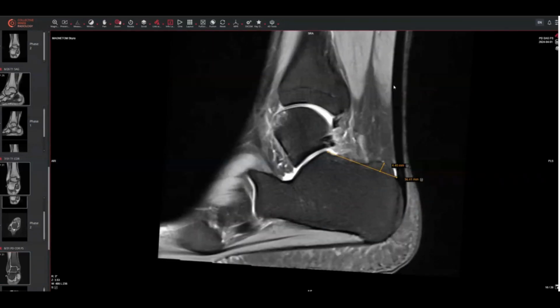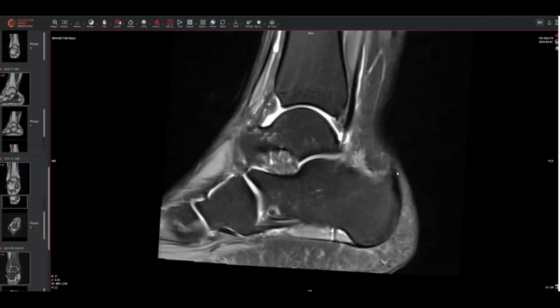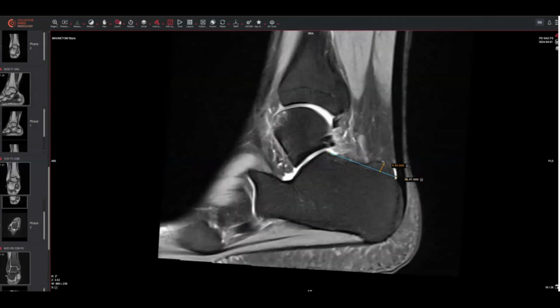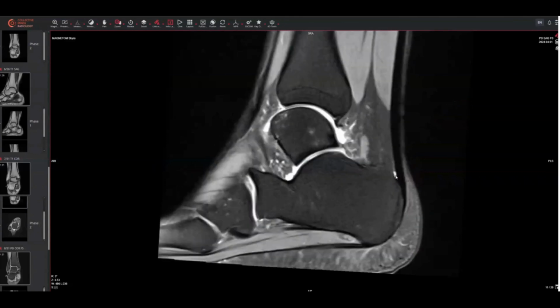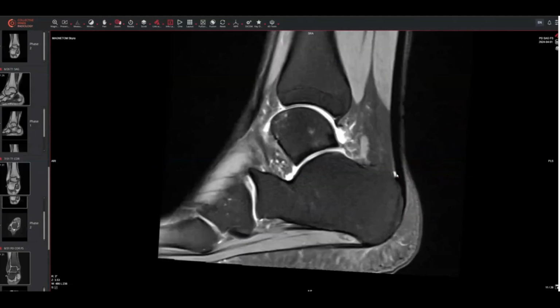The Achilles, appreciating that the soleus is inserting in the myotendinous junction above the level of the tibiotalar articulation, otherwise it would be low-lying and may predispose to claudication. The insertion is intact. Notice that we have some trace retrocalcaneal bursitis, and I've drawn a line here just showing us the Haglund bump in this patient who does not have the full syndrome that I can see of Haglund syndrome, but I can imagine a world that they do have some amount of Achilles tendinitis.